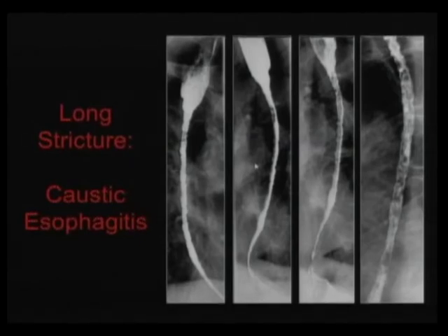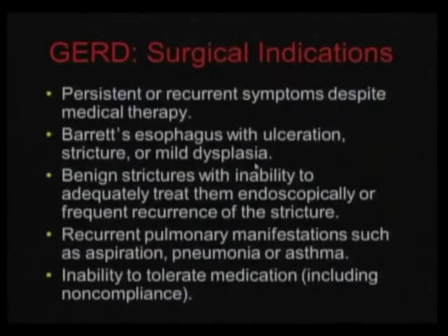This is a case I showed you last Tuesday, I think, where a large stricture due to caustic esophagitis. Okay, so this is probably the last slide.